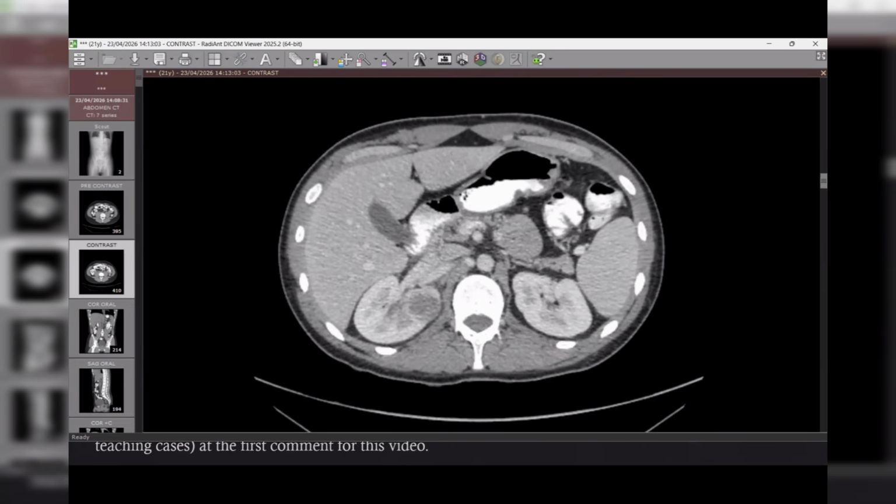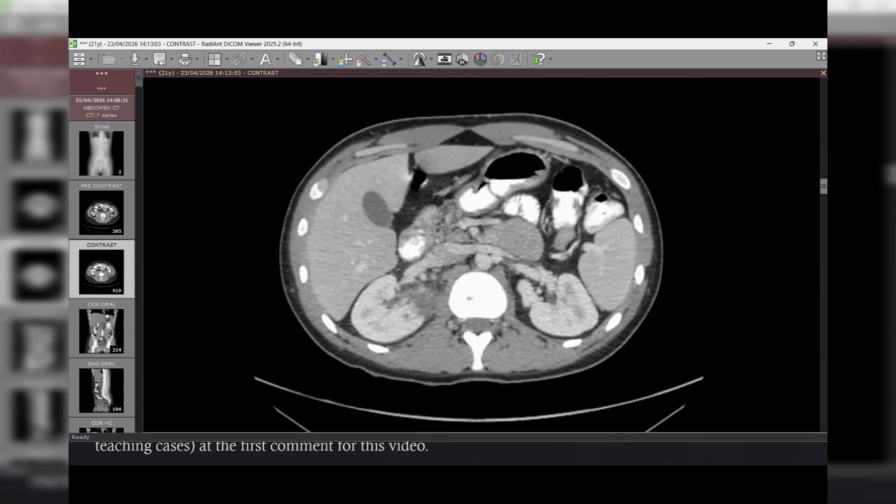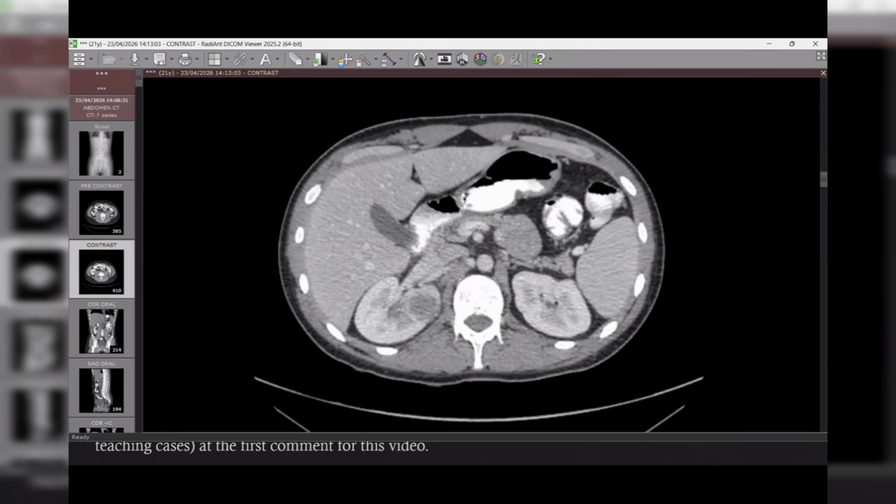So we have this stage between acute pyelonephritis and renal abscess. What is the most accurate term for this one? Could it be a phlegmon? Still not. It's called lobar nephronia. Yes, lobar nephronia, the stage between acute pyelonephritis and renal abscess. Okay, I totally agree with this idea.